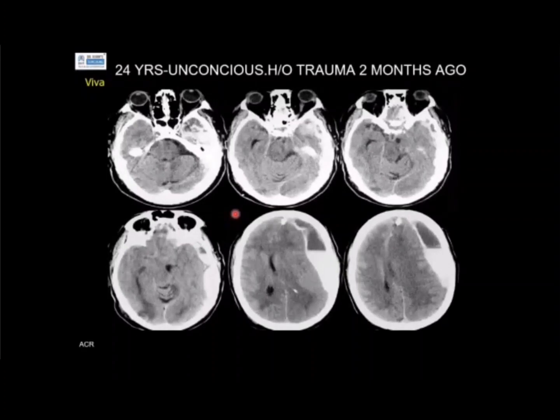If I may add, I can also see some hyperdensities in the inferior frontal lobes. I would make sure that these are not artifacts from the bone, but I would be concerned regarding any new hemorrhages in the inferior frontal lobes. In short, this is a surgical emergency. And I would pick up the phone and immediately inform the neurosurgeon that this patient needs urgent intervention for the management.